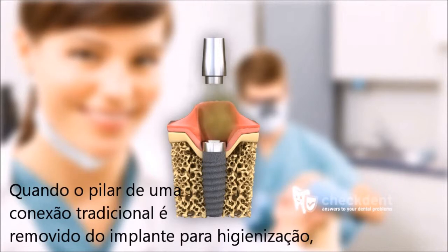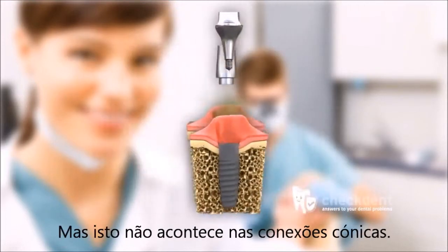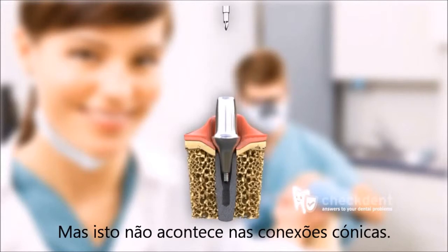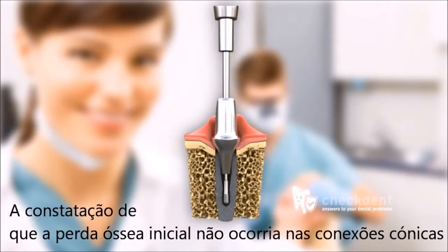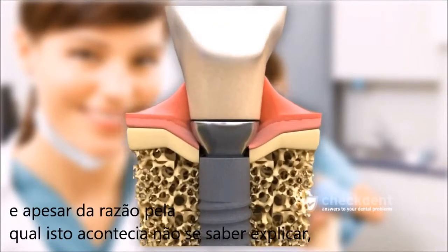When the abutment with a conventional plug-in connection is unscrewed from the implant for cleaning purposes, the dentist and the patient often notice a very foul smell. This is not the case with conical connections. However, initial bone resorption did not appear to occur with conical connections. The reason for this could not initially be explained.